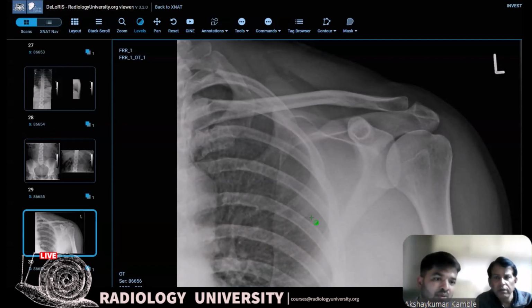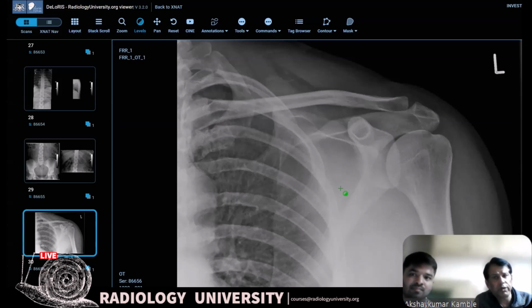Do you guys have any doubt about this one? This is again the last one. Again normal. We kept it as normal because of the alignment of the shoulder, coracoid, bony greater tuberosity, AC joint, medial clavicle, ribs, no pneumothorax. So look for pneumothorax in a shoulder X-ray, guys. Very important. They can be given, or a solitary nodule in the lung, so you can miss it with the shoulder. So look for that. Supraspinatus calcification or soft tissue tendon calcification are abnormal. They may not keep it in the exam, but they are abnormal. And as we saw with the AC joint one, think about things like that.